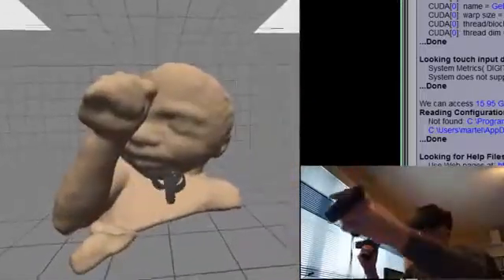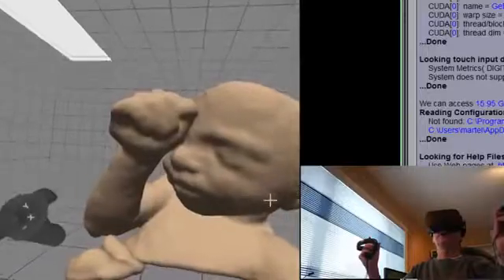And then you have it. That was the VR edit module. Thank you.